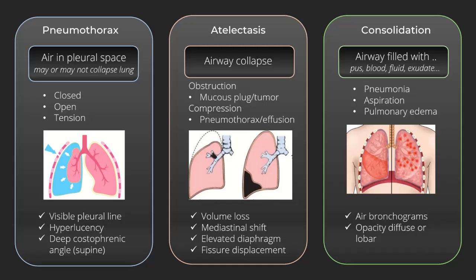Consolidation is something occupying a region of the lung. This can be localized to one area, as in the example previously seen in patient number 2, or more distributed and widely spread, such as pulmonary edema. For this condition, the affected region has more diffuse opacity and often retains air bronchogram markings.